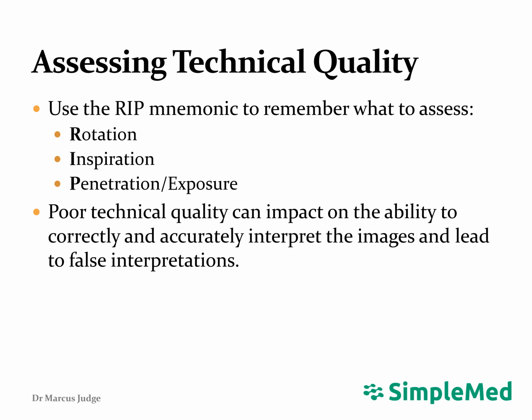Prior to looking to identify pathologies, it is important to check that the image you are looking at is as accurate as it can be. If an image is not technically adequate, it can lead to incorrect interpretations and can cause pathology to be missed.